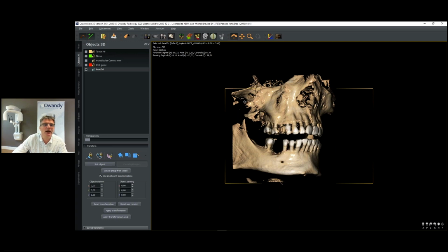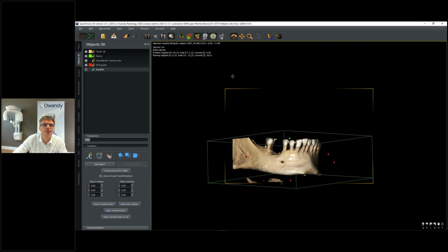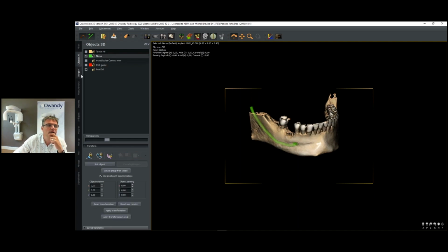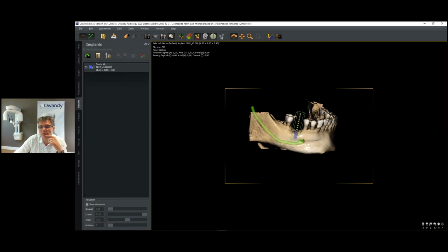And when we added this, we had this implant, we just reduce a little bit the volume here. Why it's very important to take care about the position of the nerve is because the nerve here is close to the implant. We have to place the implant in a way.